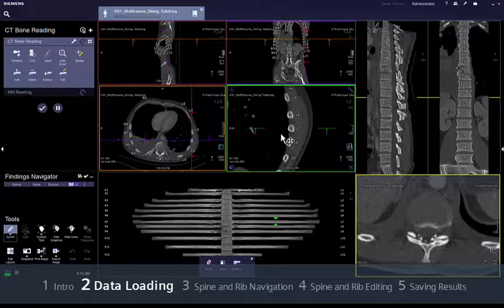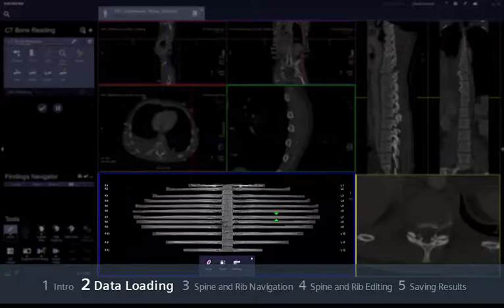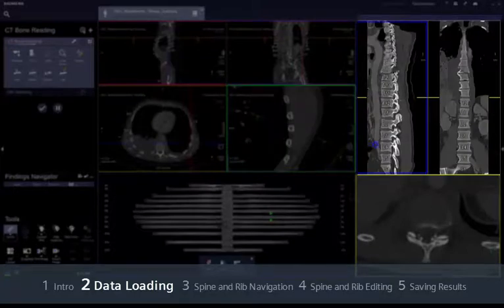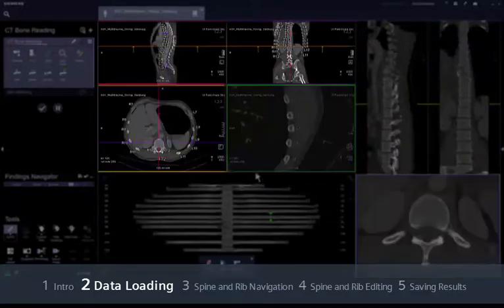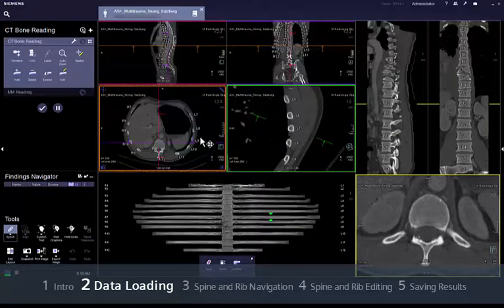The layout of the screen is automatically selected depending on the monitor configuration. In this case, the study is opened with 1. An unfolded rib segment, 2. A cross-sectional rib segment, 3. An unfolded coronal sagittal spine segment, 4. A cross-sectional spine segment, and 5. 3 MPR segments with orthogonal orientations. Labeling for the ribs and vertebra are displayed in all segments.